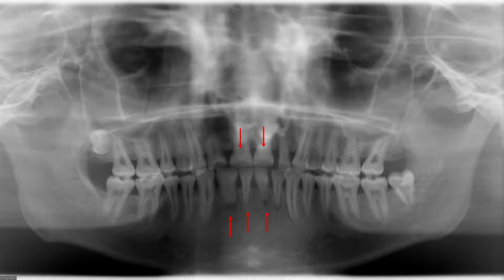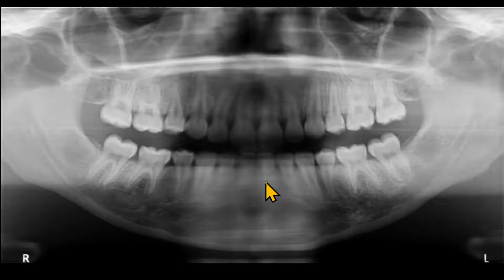Again, this is our phantom in a plastic. Same phantom. Let's look at the anterior teeth of both arches. These are wide. We remember that when the skull was too far anterior, the anterior teeth looked like matchsticks, the same teeth. This is an example of a real patient. The anterior teeth of both arches are very wide.